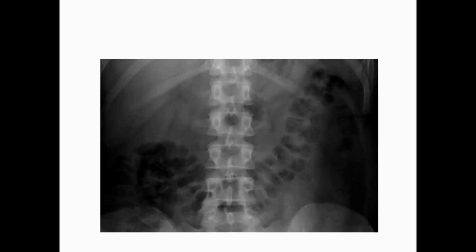So the features of the large bowel: peripherally located, the shape is haustra, which is an incomplete mucosal fold, and the diameter needs to be less than 6 centimeters.